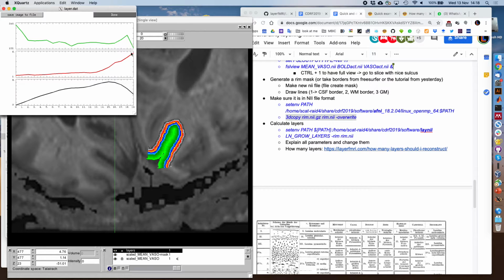This might be mostly due to physiological noise, because somewhere here we have this elbow shape. So here we don't have any leakage from pial veins anymore, and it's more flat. We see, if you want to see it, that we have this huge peak at the superficial layers from the veins. Maybe there's a shoulder there, which Koopmans also showed in 2010 already.